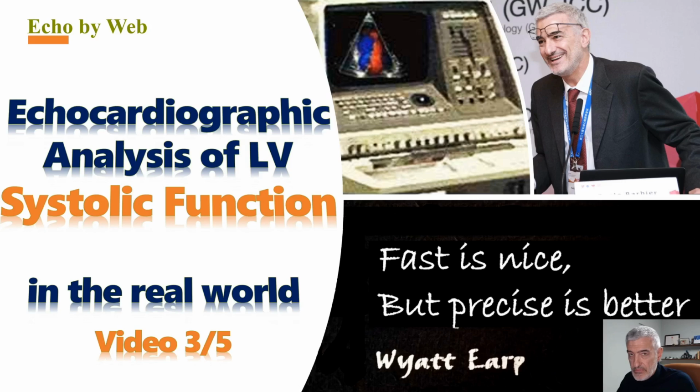The topic of this talk, which spans over 5 videos, and this is the 3rd video, is the echocardiographic analysis of the left ventricular systolic function and dysfunction as seen in the real world. This is, of course, a basic approach to the topic, which is quite large.